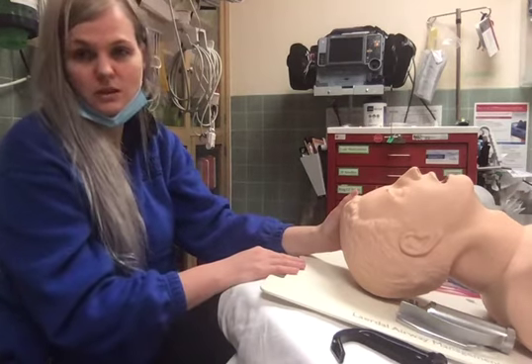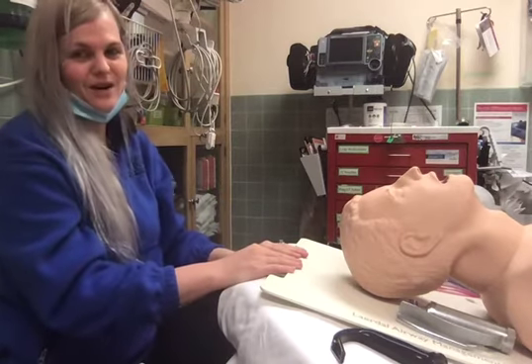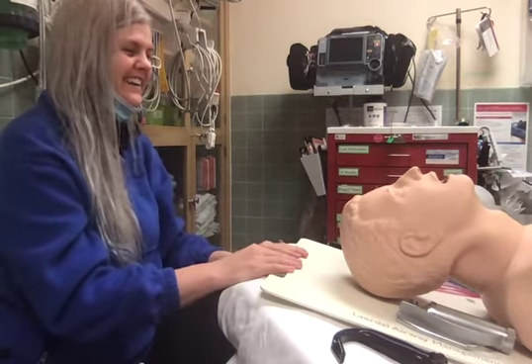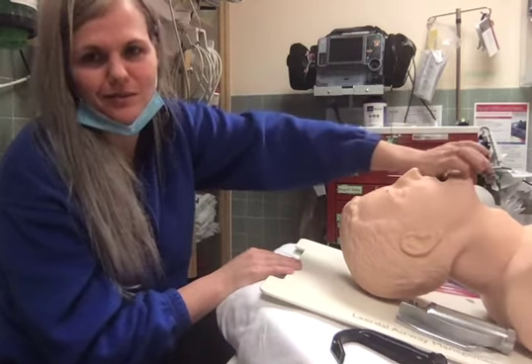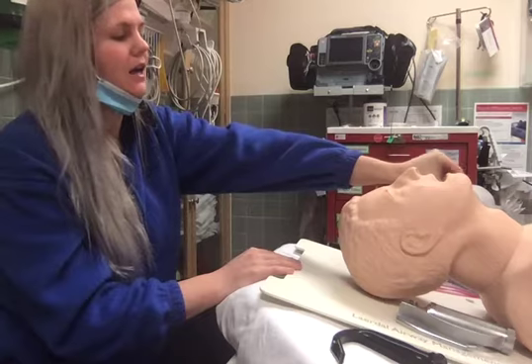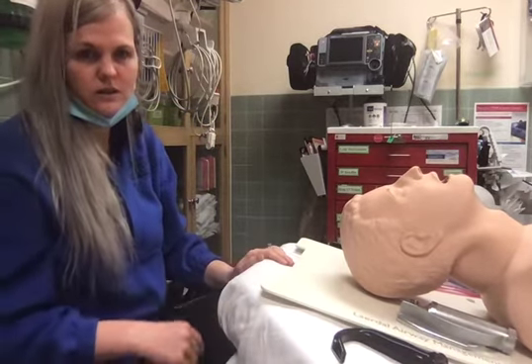I haven't missed an intubation in 2.5 years using this method. Not bragging, just saying. But it does prove to be very effective. Prior to that, I was running about 50% first pass success. And so it seemed as though raising the head made all of the difference.